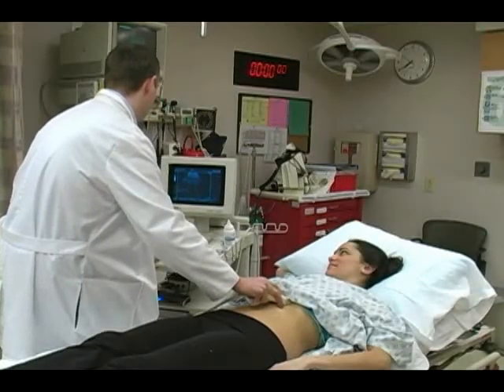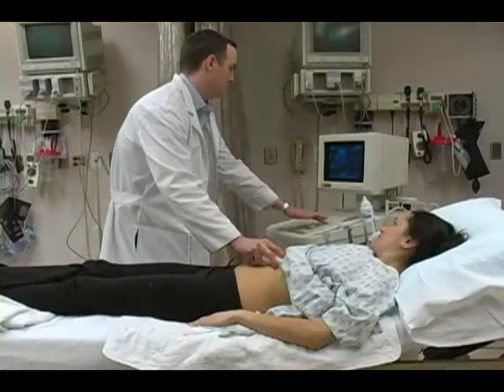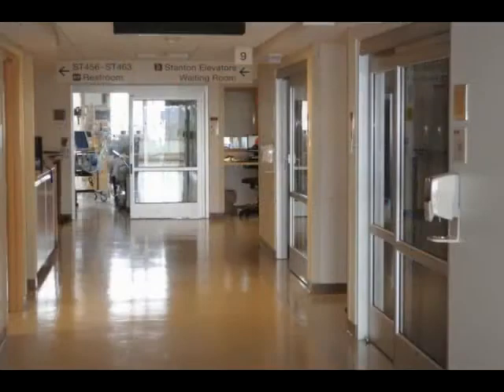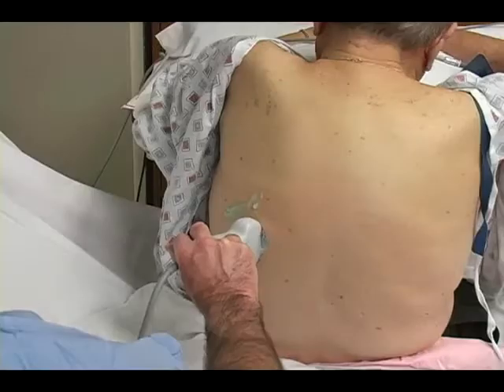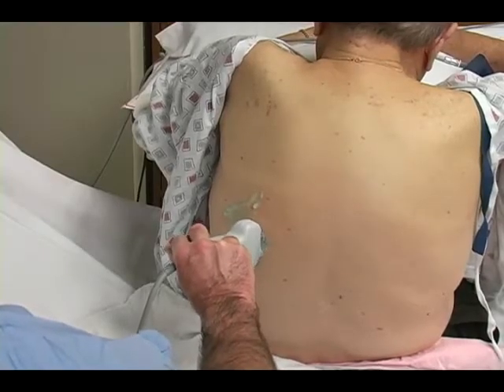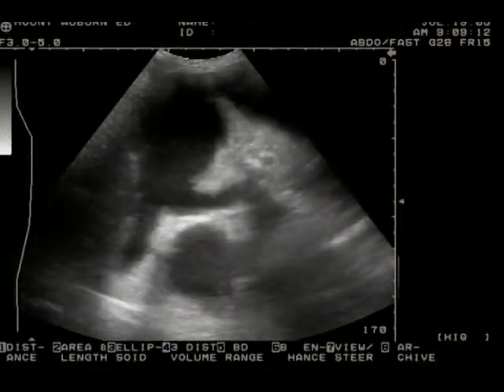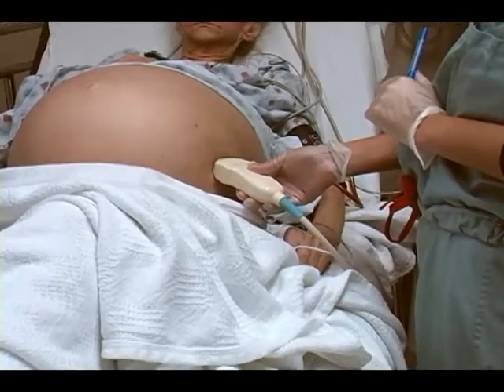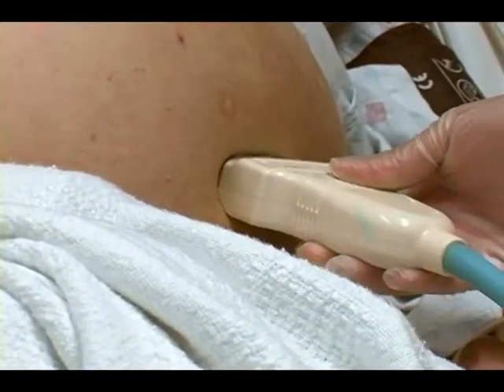Within the last 2 decades, the ultrasound machine has migrated outside of the radiology suite and has now begun to be used by the non-radiologist in the medical wards, intensive care units, operating rooms, emergency rooms, and clinic offices. Doctors from multiple clinical fields have started to utilize these machines at bedside for both procedural applications and for diagnostic purposes. This video will introduce the basics of bedside ultrasound and will outline some common applications of bedside ultrasound in medicine today.